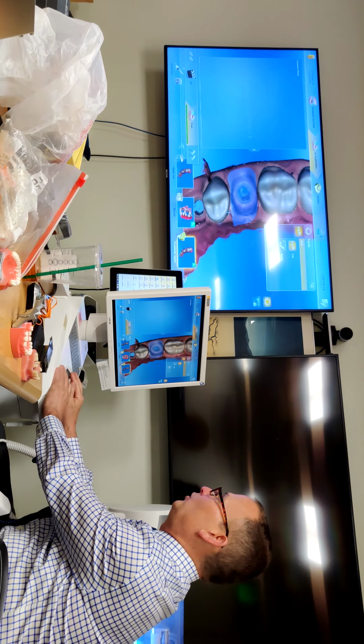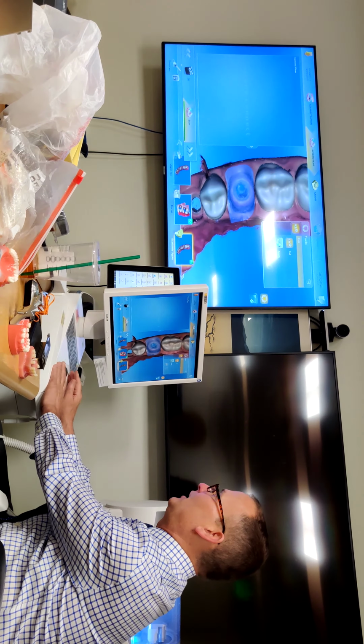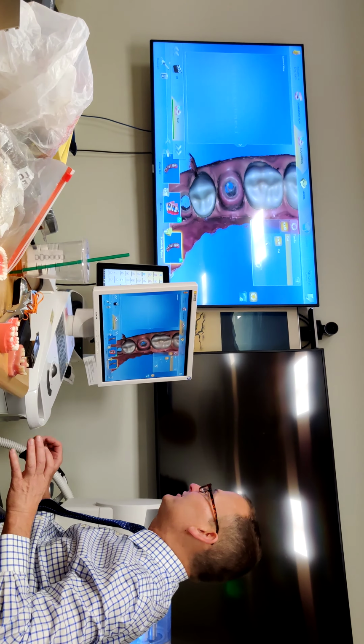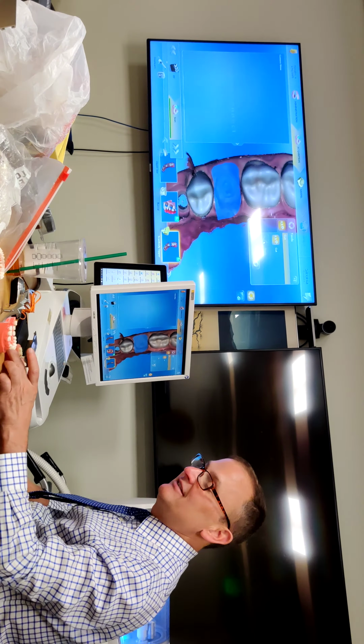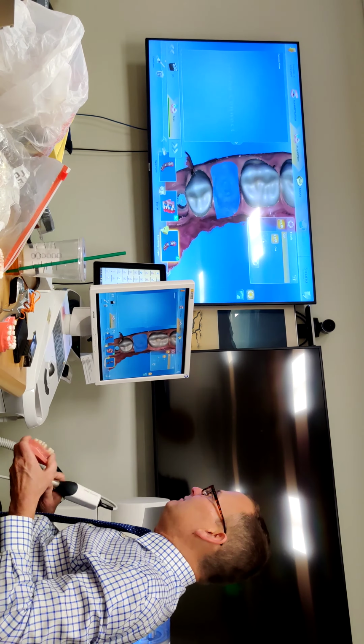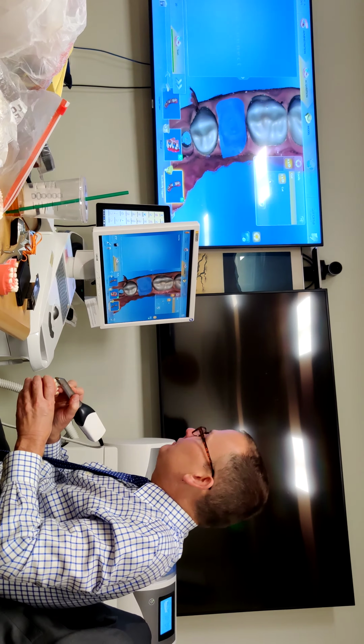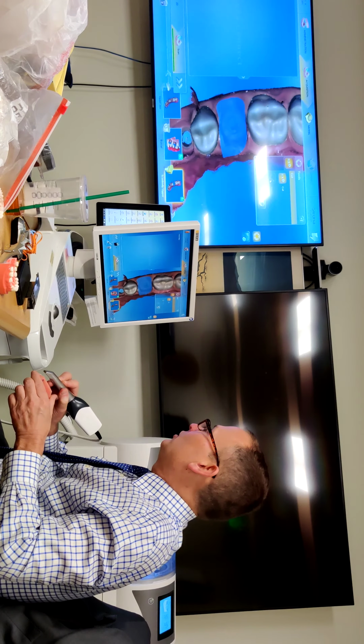This is what it says I'm cutting out. I hit apply, and it's going to remove it. So what I've done is I don't have to rescan everything. I just have to rescan that one area to make everything faster, okay? And so now let's go back to our model, and we're ready to scan.